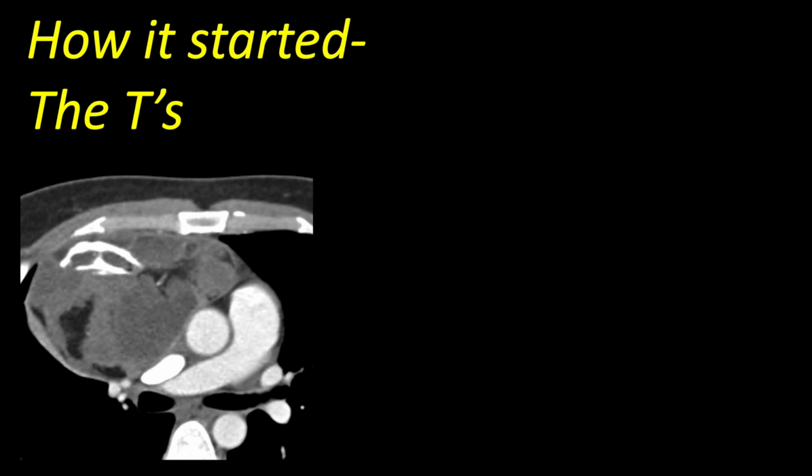But it gets a ton of attention in teaching, both with medical students and with residents, and the teaching really revolves around the T's, right? Everybody knows the T's of the anterior mediastinum. The first one shown here, it's a young patient, a relatively encapsulated mass containing fat, fluid, soft tissue, and some calcium or bone. This is just a mature teratoma, so very easy diagnosis here in this young patient.